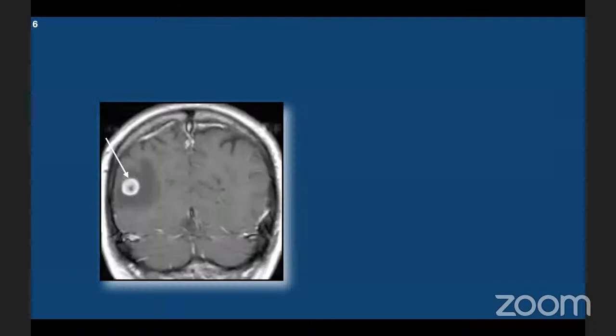This cancer patient presented with headache and seizure with altered mental status. MRI shows a round intraparenchymal space-occupying lesion with central necrosis at the right parietal lobe. There is moderate perilesional edema and intense peripheral ring enhancement at the gray-white matter junction. The central necrotic region showed low signal in T1 and there is thick peripheral enhancement.